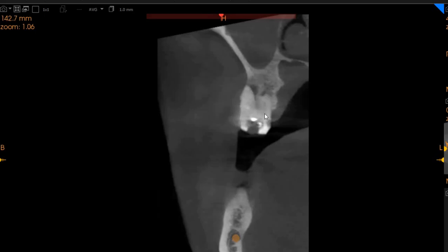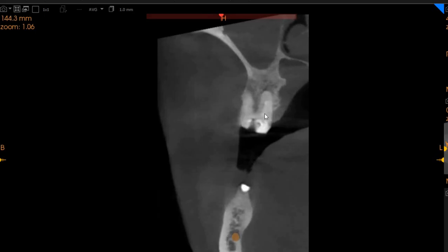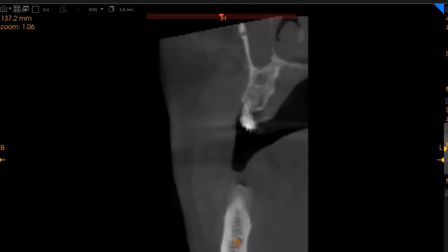This is the upper left molar. It is ghastly carious. We've got a chamber opening situation with a periapical radiolucency. If this tooth is extracted, the ridge width is 12 millimeters and the height is 10. This definitely can receive an immediate implant.